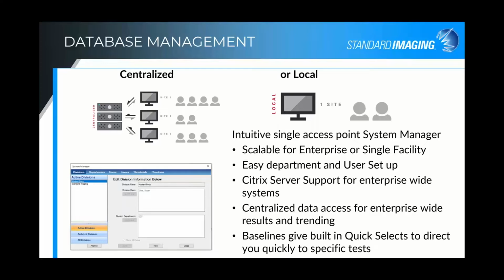It's also nice that you can set up easy baselines, and those give you quick select, so you can just jump right into your test. You don't have to do any setup. You just grab the test you want to do and bring in the results, and it will calculate everything for you as far as the imaging or MLC tests, things like that. Everything is at your fingertips.